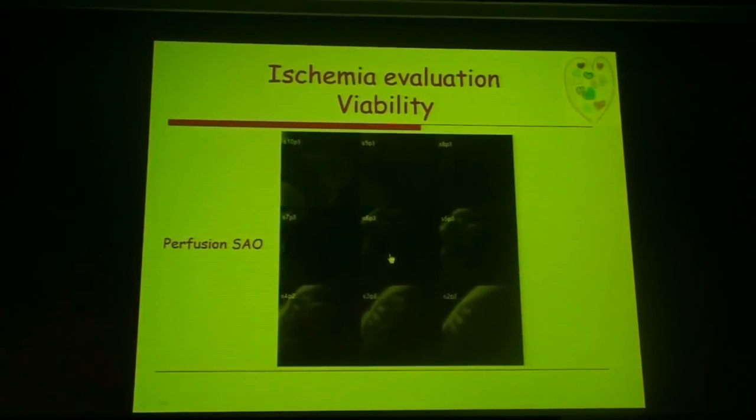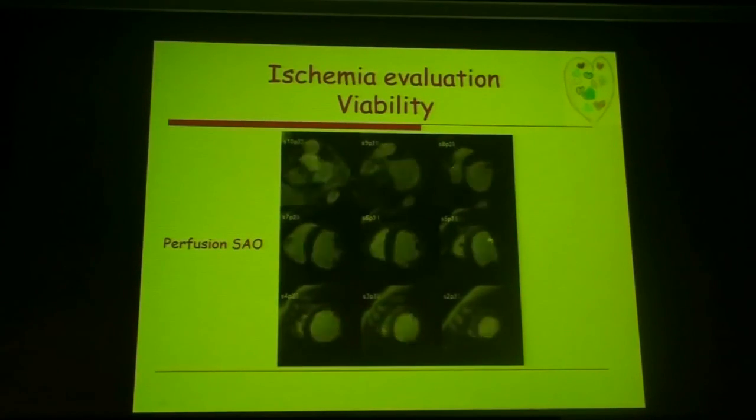Let's take a look at the perfusion images. As we're looking at the perfusion images, look very closely at what's happening here. So the inferior septum, the basal level, and the inferior wall, we do see a perfusion defect. And frankly, there's no myocardium there. It's total scar. The other thing that we can also suggest is that there is a subendocardial perfusion defect anteriorly here at the mid-LV and mildly in the lateral wall as well.